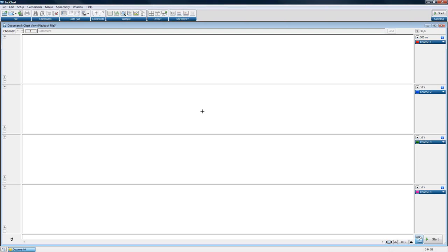And this file was recorded using a two-way respiration circuit. So both inhalation and exhalation are going through the flow head. You do not have to use a two-way circuit with the spirometry extension. You can use a simple one-way circuit where either inhalation or exhalation is going through the flow head. A word on the flow head orientation and expiration.